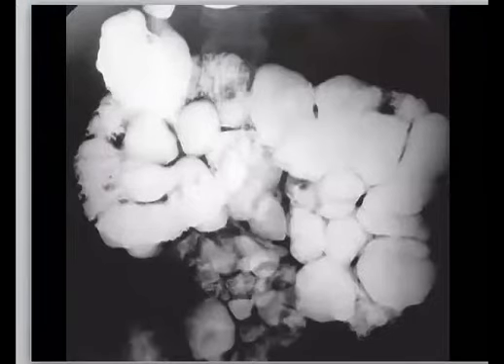So this one is a bit difficult, but we can imagine that this bowel should be the small or large bowel. Is it a small bowel or large bowel? Yeah, so this is small bowel, nice. And the small bowel here is dilated overall with a sac-like appearance.